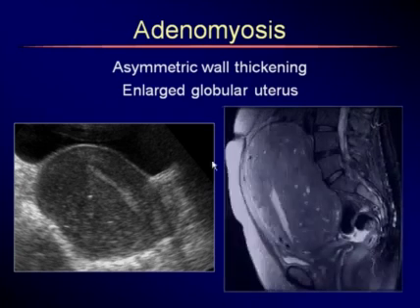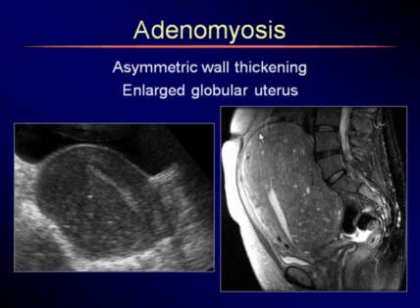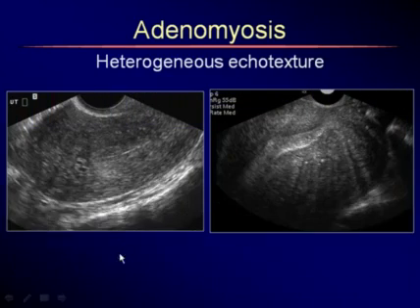This is the corresponding MRI scan, which shows us this markedly thickened posterior wall, these small little fluid areas, areas of bleeding. If you look carefully, you probably will see that there are little collections in this wall to correlate with the MRI. Another finding is heterogeneity.